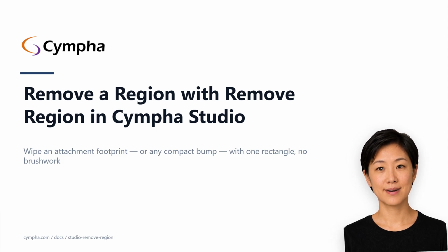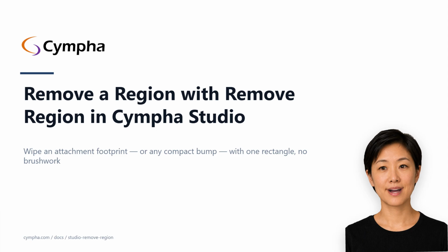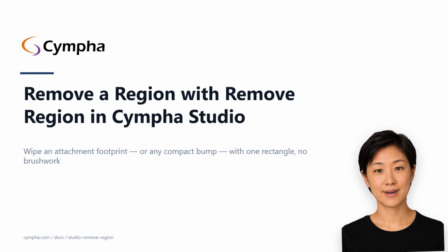In the next few minutes you'll know when this tool beats the brushes, how to invoke it, how the rectangular drag selection works, the typical attachment removal workflow, and what happens at the edges of your selection. It's a short one. Follow along in Studio, or listen now and read the guide later.